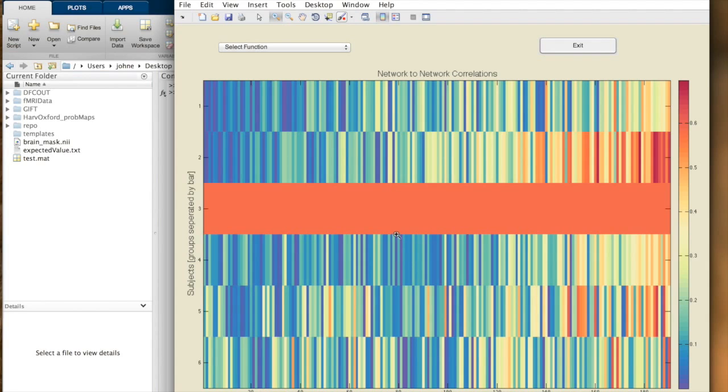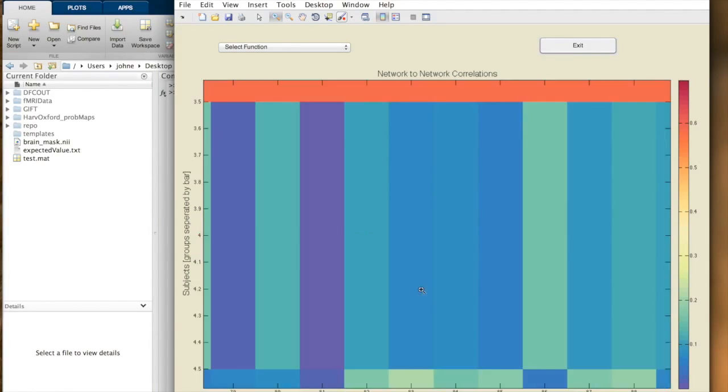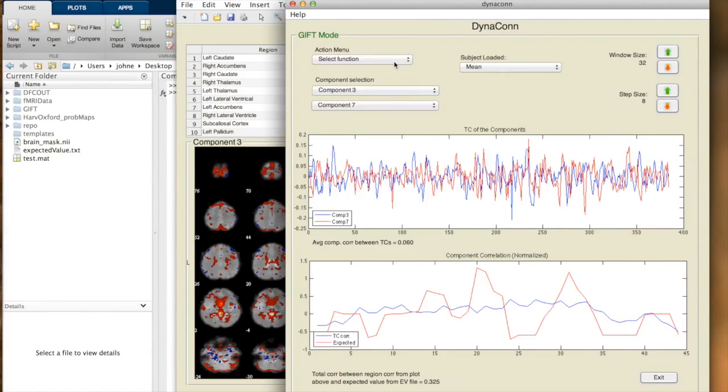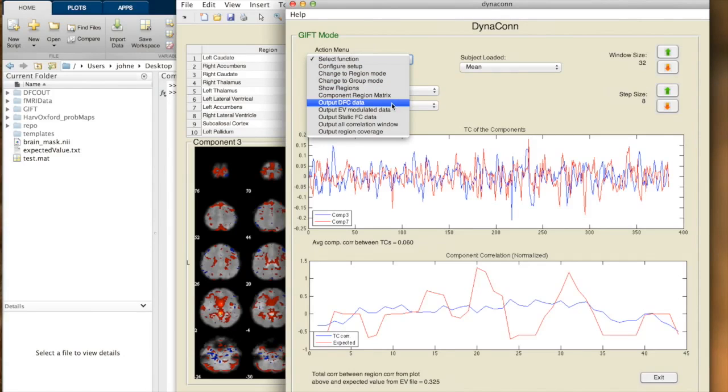But I do want to show you can use a magnifier to zoom in to a particular area, and then you can use that function to click on one of these results, and that will update both the main viewer and the component viewer to that new component-to-component combination and to that new subject.